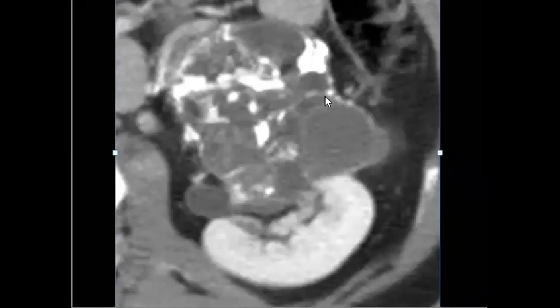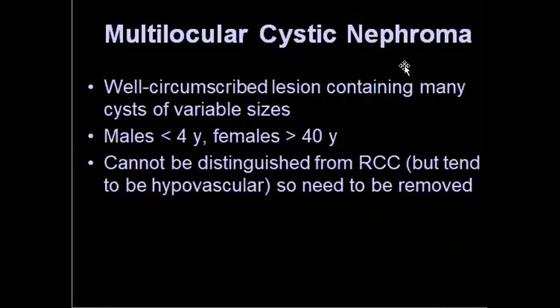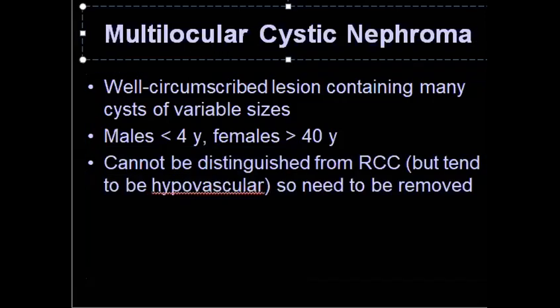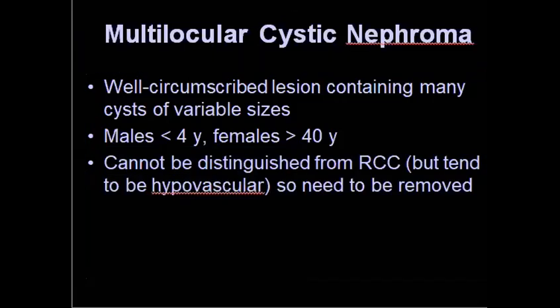What else could be included other than that? Yes, maybe you can just mention something called multilocular cystic nephroma. They cannot be distinguished, as I mentioned, between RCC and the multilocular cystic nephroma, but it is good to mention it as a differential diagnosis.